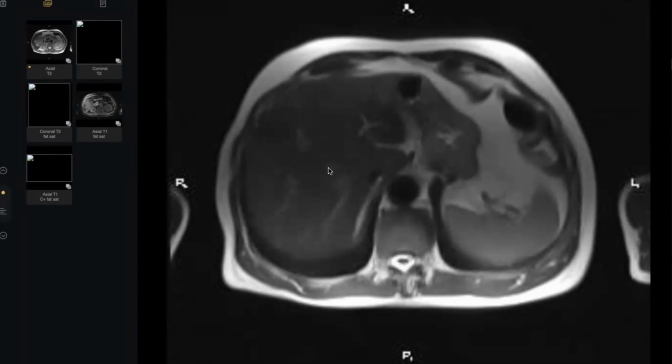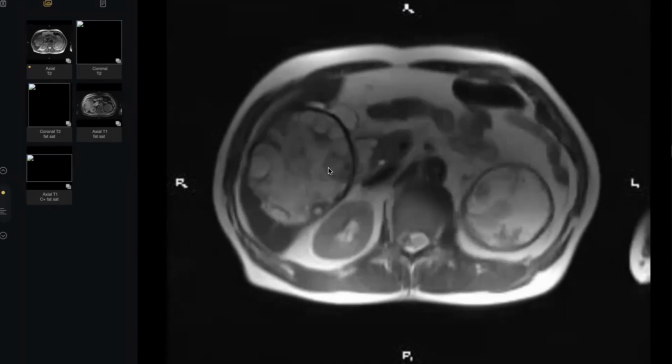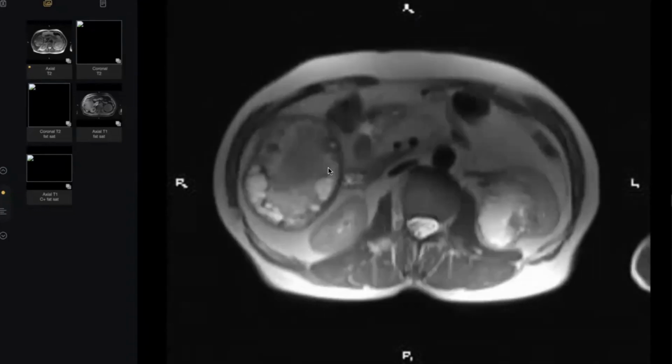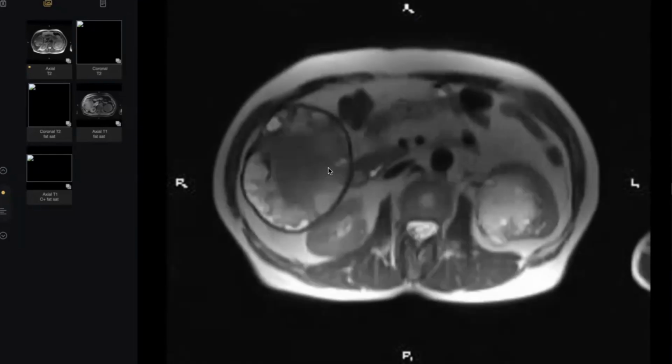So, what's your diagnosis? Sir, I would give hydatid cyst as the differential. I would inform the referring physician of my finding, and ask about the echinococcus titer of the patient as well as any previous imaging, because they may have a long-standing history, with calcification and other things. Since it is multiple, I also want to check the lungs and the entire body. They also require interventional radiology review, because we need to aspirate, but this seems to be multiloculated, so it's less likely to be successful for the interventional radiologist.